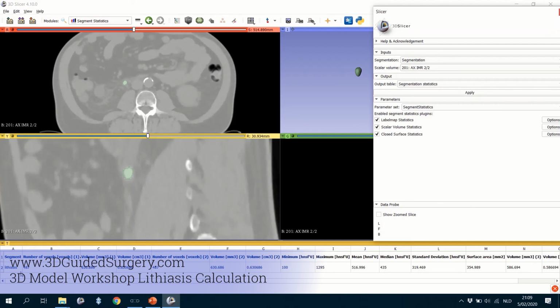And here we see that our mask, which is just this volume in 3D, has a volume of 630 cubic millimeters. The Hounsfield units, the minimum is set on 100, which was our lower value. The upper one of what remains here is not 1380 like what was the maximal Hounsfield unit in this scan, but is lower, at 1295. And we see though we can also have the surface area and other characteristics that might be useful.